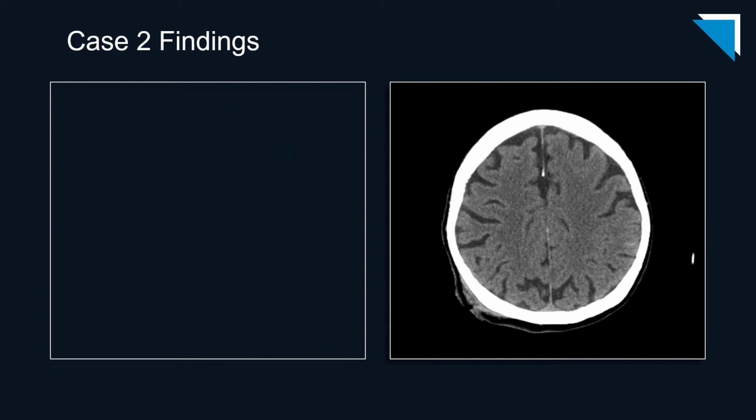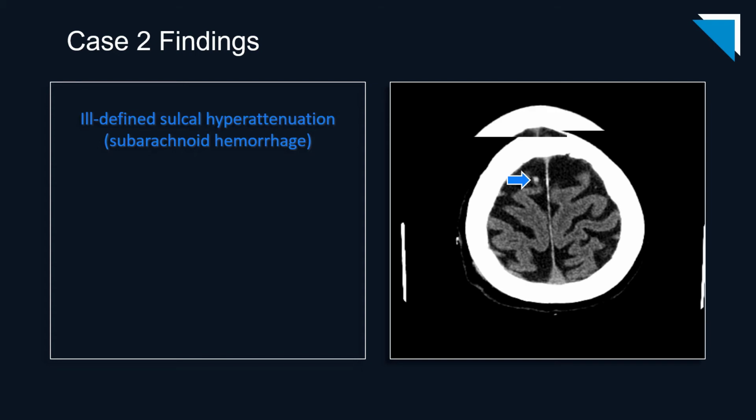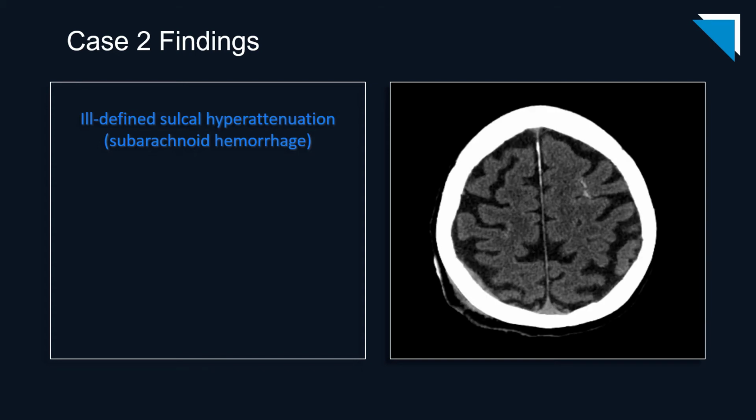If you were satisfied with that finding and rushed through your search pattern, you might have missed additional areas of acute hemorrhage. More posteriorly in the left parietal lobe, and a bit higher up at the right anterior vertex. If you made all these findings, you might be feeling fairly satisfied that you had found all the blood products, but you would be wrong in this case.